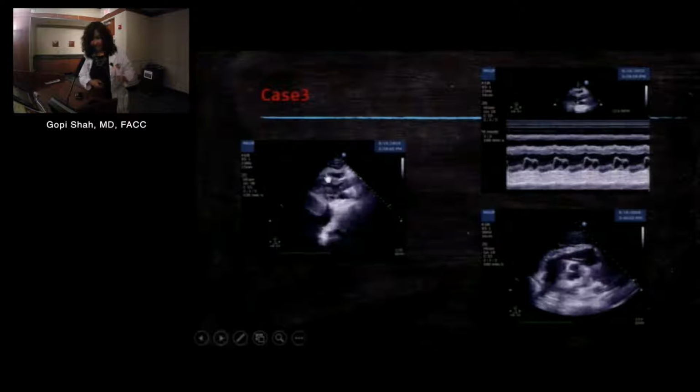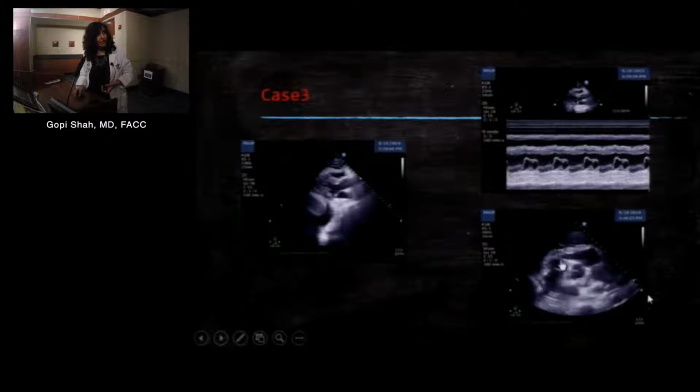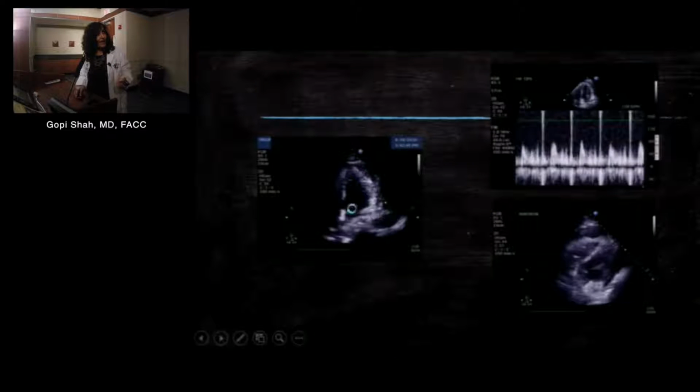And you can see it even in this view that there is the RV-OT also. While there is no obvious collapse, it seems to be, as we would say, struggling to stand up. And in this view, you can see that there is some echogenic material around the heart.